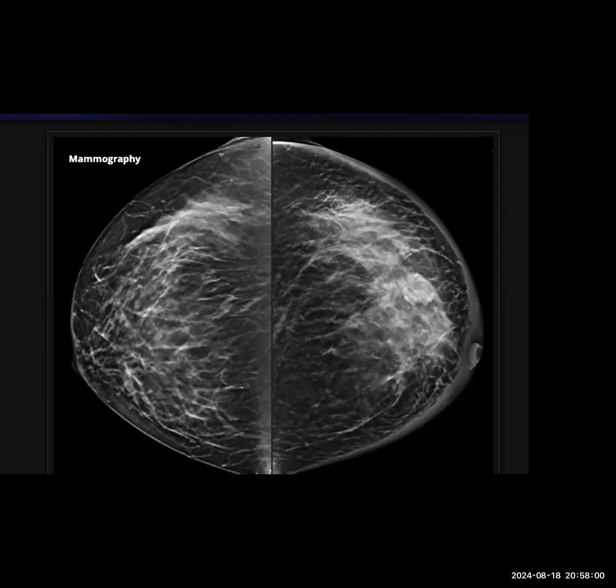Other than that, I can see a large area of density in the retroareolar region, extending towards the superior aspect. It is showing significant fibrofatty thickening. Can you click and show it to me? This is the thickening. This is the lesion I'm suspecting.